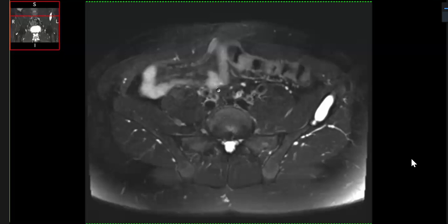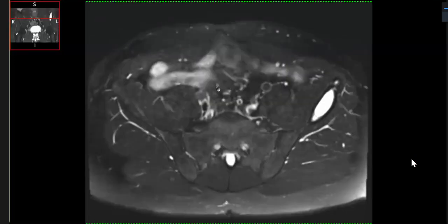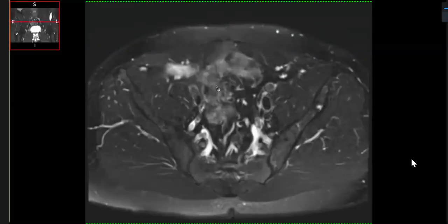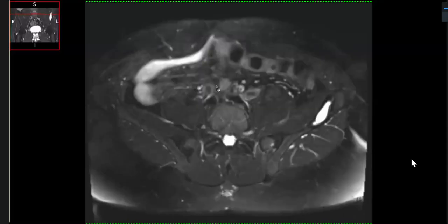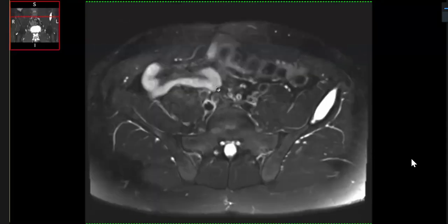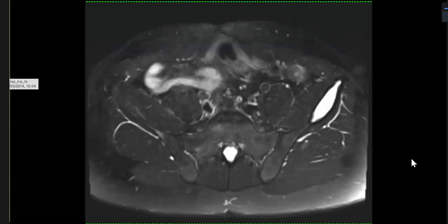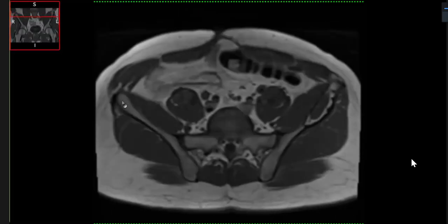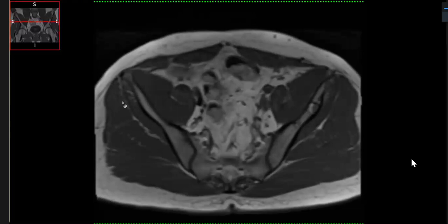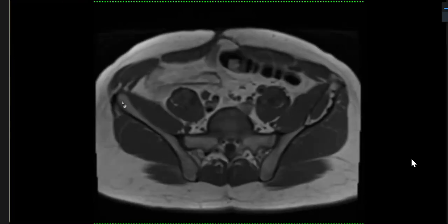I'm provided with MR axial T2 fat sat, in which this is a hyperintense, well-defined bony pathology. It has got hyperintense signals on T2, no cortical breach. Sir, can I see the corresponding T1? No extension into the muscles. It is hypointense on T1 and no hyperintense component is seen within it. So no hemorrhagic component, no fluid levels.